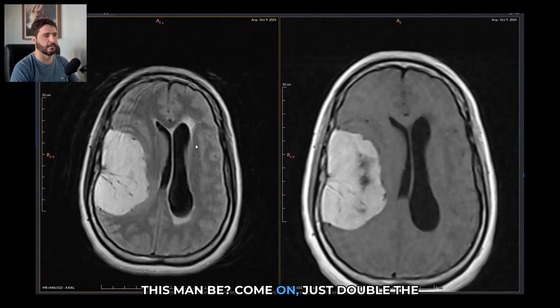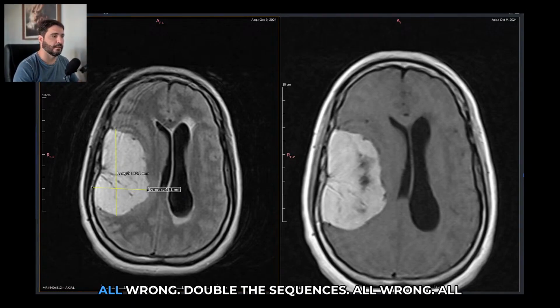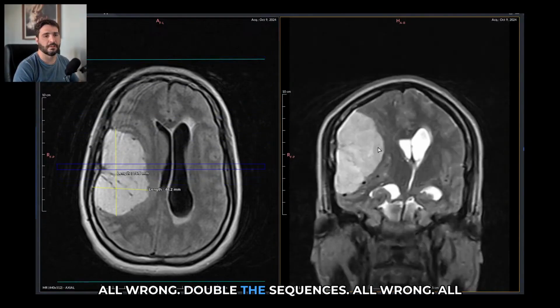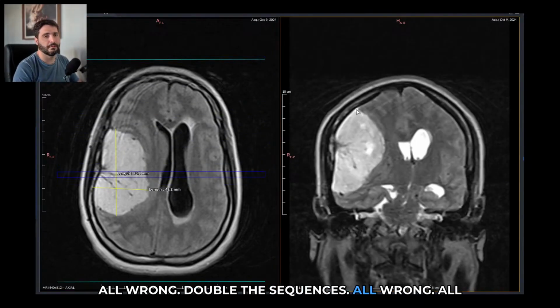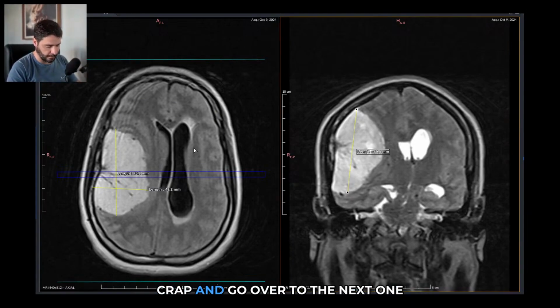man be? Come on. There are double the sequences they are supposed to do. All of it sucks. All wrong. Double the sequences, all wrong, all shaky, all mispositioned. Yeah, let's just report this crap and go over to the next one before I pull my hair out and spill my coffee.